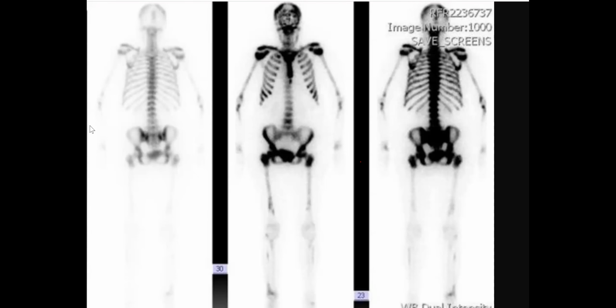Okay, no radiotracer uptake is noted in the bilateral kidneys, so this is a super scan. Very good. Step one: super scan, with intense radiotracer uptake in the axial skeleton. Very good. Step two: it is most likely in keeping with a metastatic super scan.